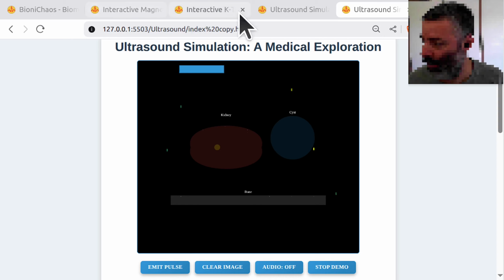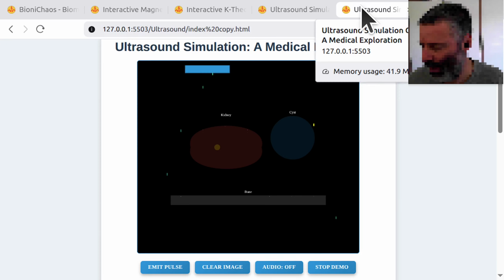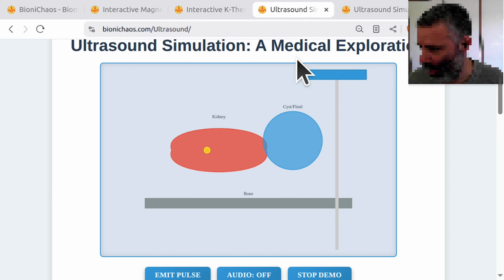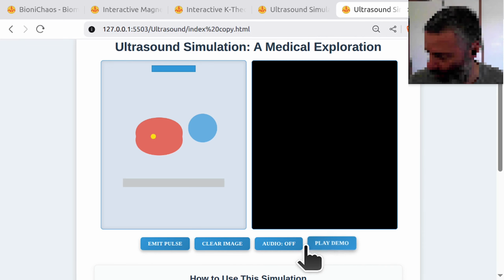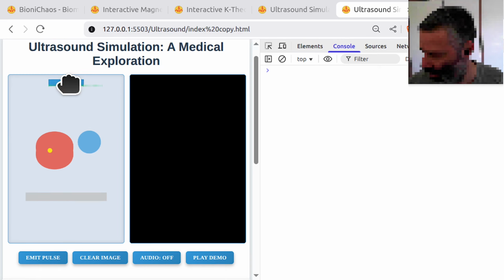And let's see. That's the original one. The new thing doesn't seem to be a major improvement. Okay, so we have a better version. Play mode. Play demo, sorry. Oh, yeah, the play demo should not stop. Can't move the probe.